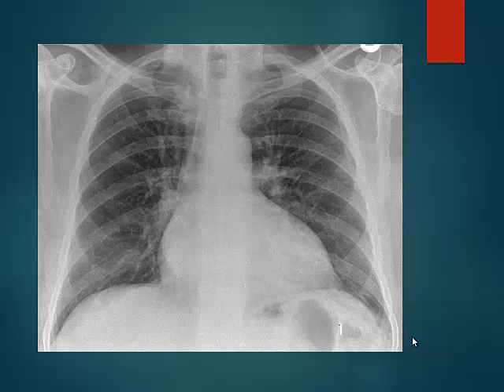Okay, so looking at the pulmonary vessels, we're looking at upper lobe vascular redistribution or upper lobe diversion. What are they? Are they arteries or veins? Veins, yes, they're veins. So why are the veins distended? What does it mean? There's increased pressure in the left atrium. What's the normal pressure in the left atrium? Less than 10? Yeah, less than 12. Up to 12 is the normal pressure in the left atrium.